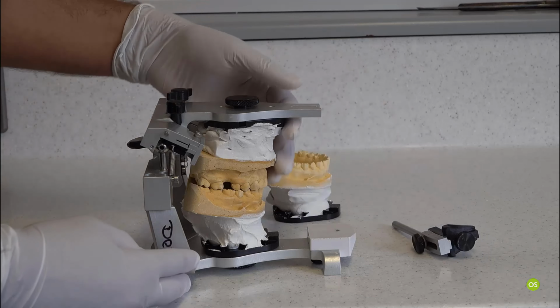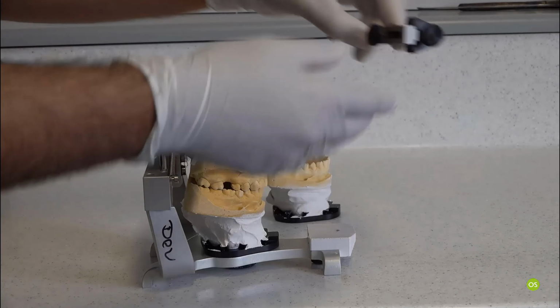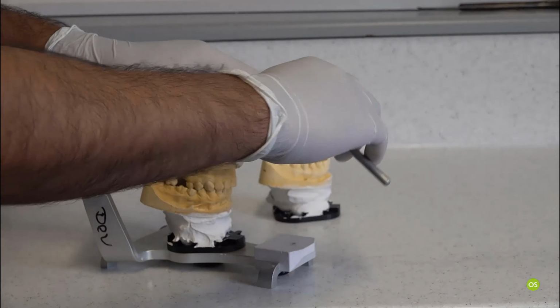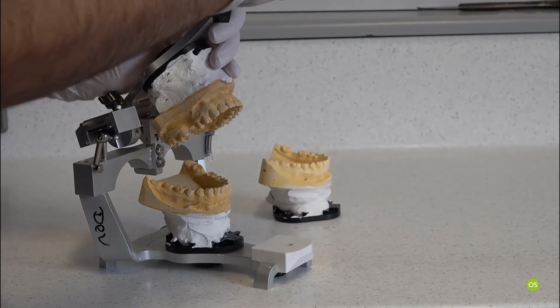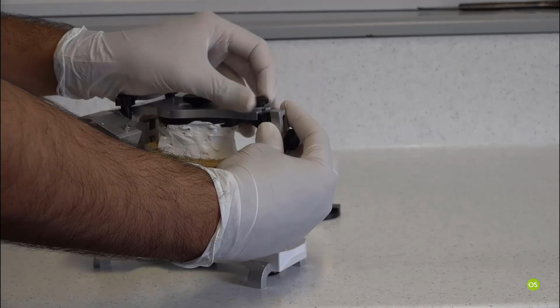Whereas if I lift this up a little bit, then this is CR. Now, you need to really understand that the articulator is not an exact science. So for CR, if you're doing a teeth apart position, then if you're relying on CR, the best ideal CR would be the CR you mounted the models in.